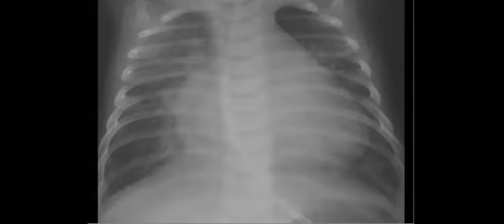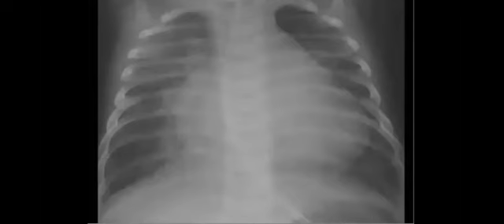Okay, and it can be this appearance. So the most important is endocardial cushion defect. Perfect. So when you find duodenal atresia, the association will be in 30%. VATER is also associated with duodenal atresia. Yeah, okay, I agree with you. Mostly in the region of the ampulla of Vater, right? Do you mean this? Yes. Perfect.